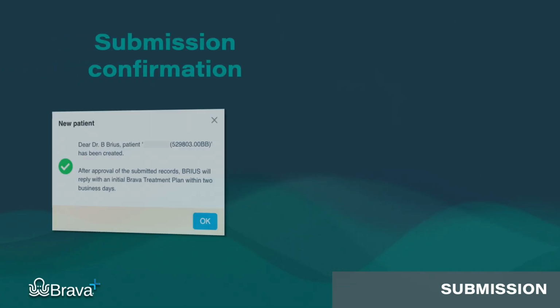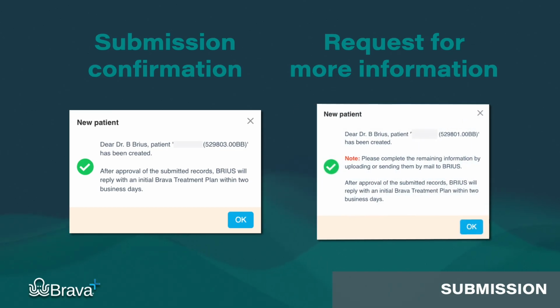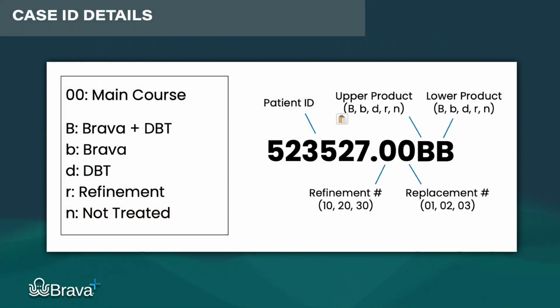Once the case has been submitted, a confirmation will be displayed. If all required records were not uploaded, a note will be displayed in the confirmation box asking you to send the required information. This is a review of the details included in a case ID.